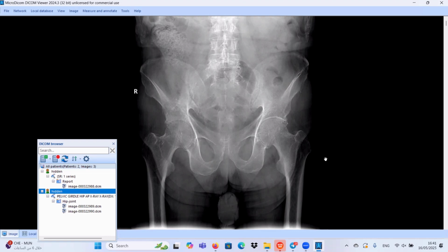What's your opinion? I'm looking at the radiograph of the pelvis of a skeletally mature patient. Firstly, I think that the right SI joint space is slightly widened as compared to the left. I could appreciate a tiny erosion at the right as well. The left SI joint seems fine. In the rest of the bones, I could not appreciate any lesion.